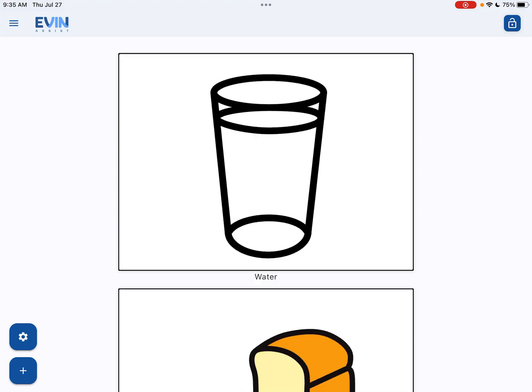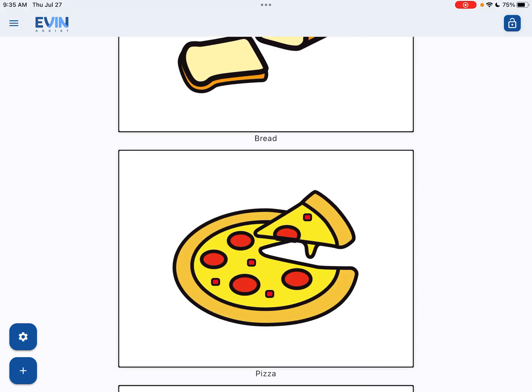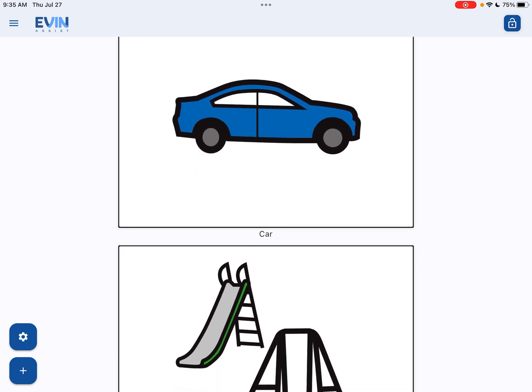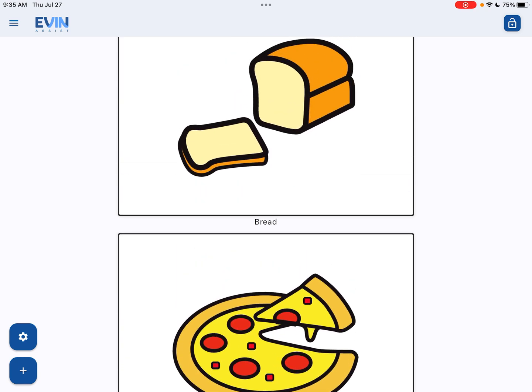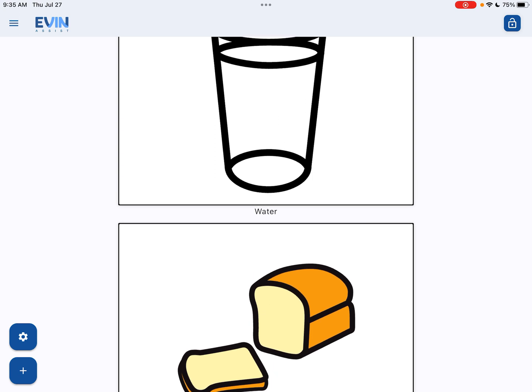Again, the reason why I'm tuned into looking for apps like that is I've had a couple of AAC users who weren't able to use traditional grids, but liked this scrolling motion. Of course, Proloquo2Go has a scrollable list option, but for something free to try, and again, all of this would be editable.